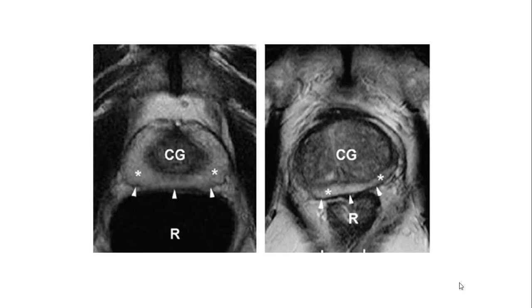These are the last two MRI slides that I wanted to show you. And as I'd mentioned before, there was one slide where there was going to be a scan with the endorectal coil and one without. And while usually you will see much brighter signal near the endorectal coil, in this case you do not, and they may have made some adjustments to their technique in order to even out that signal so that you don't get that bright white signal right next to the endorectal coil. These are both axial images.